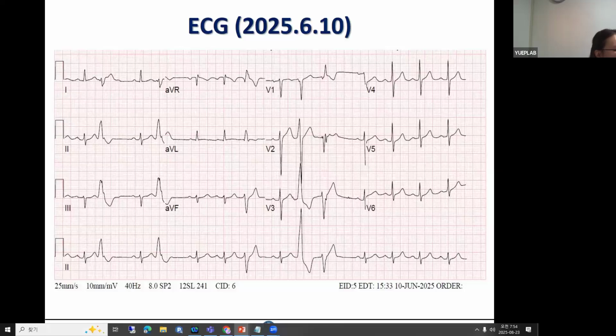Even the sinus rhythm QRS, is it normal? Normal echo? Okay. Mid-range EF reduced. Reduced, yes. First it was 48, now it's 47. So what will you suspect? What is the differential diagnosis based on the ECG?